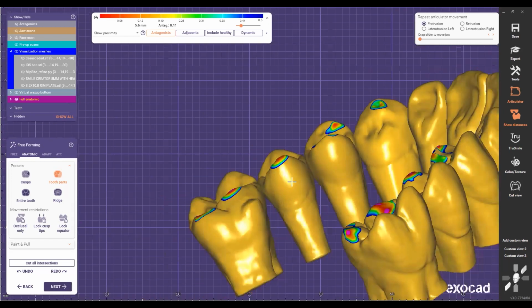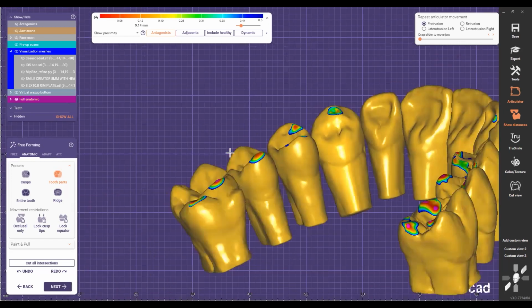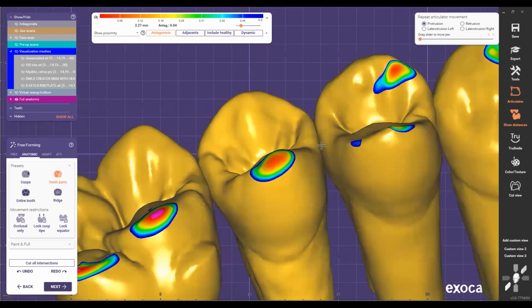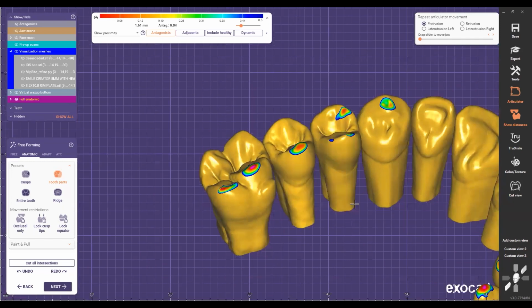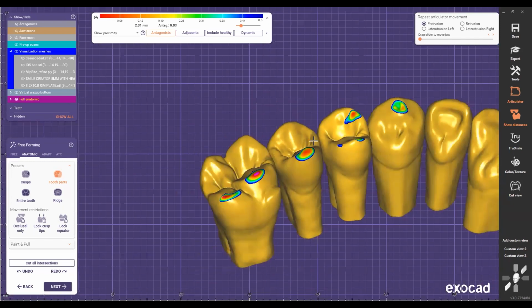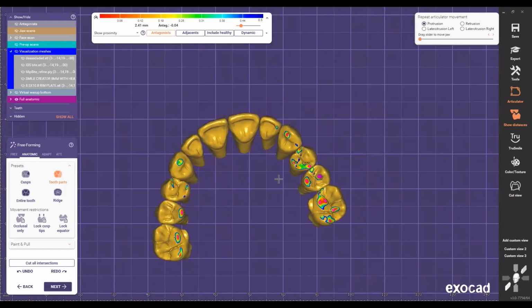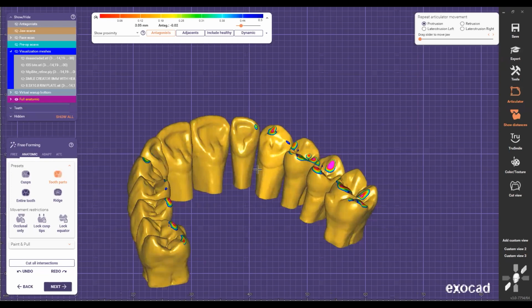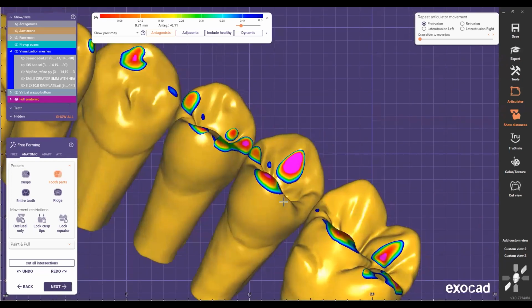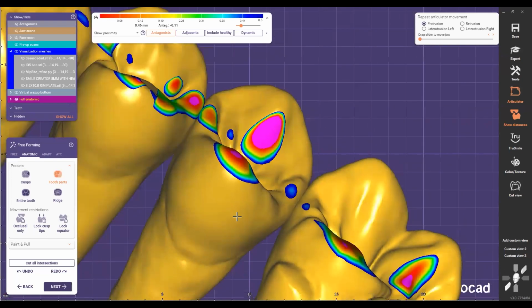Also, one of the things that I check is the height of the ridges, the mesial and distal ridges, to make sure that they're even, right? You don't want to leave one ridge higher than the other one. So there's a lot to know once you start doing these cases, right? But it's fun once you understand those things. You're going to have a good eye on how to handle these cases and get it done the proper way. So you guys can start doing these cases by following those little details, right?